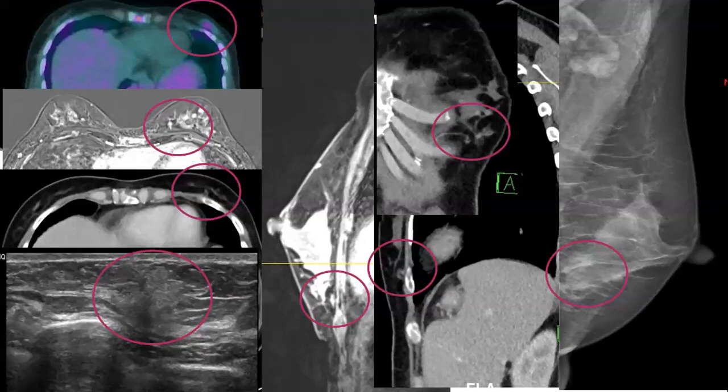Yeah. We have, yes, because she's a female. Even if she's young, I was arguing that way. Since she's a female, we have to think about breast cancer. We have to exclude breast cancer. And we have to consider any lesions to make sure it's not a cancer in this lady, since she has a metastatic disease, unless we could find another primary. Since there is no other primary, you see, breast will be number one.